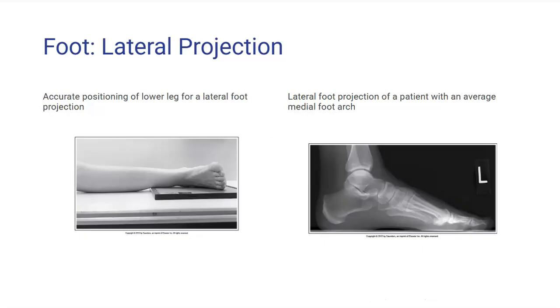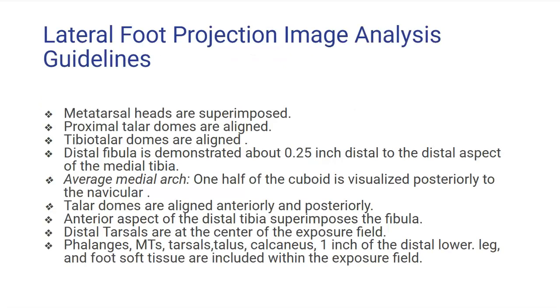Here is some additional pictures of accurately positioned patient in a lateral foot projection. Here are those image analysis guidelines for your review.